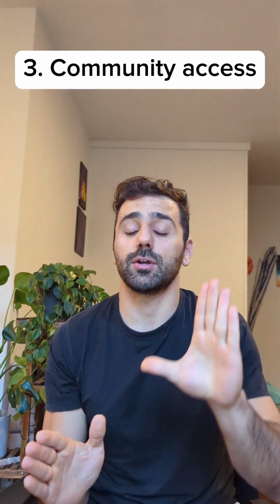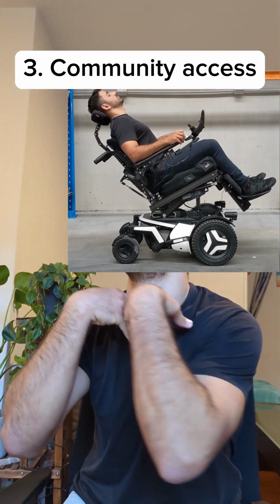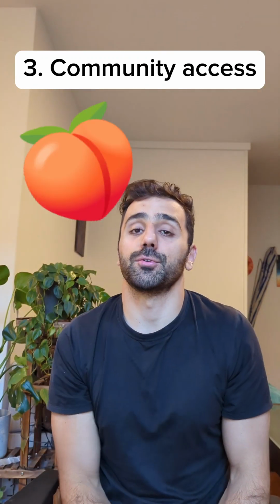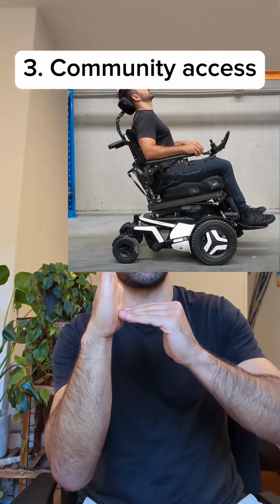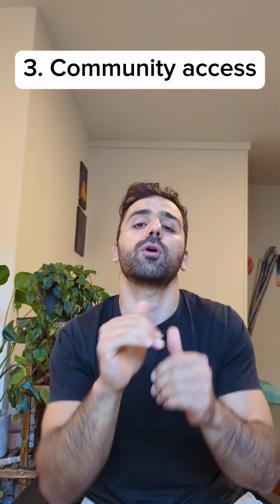Woo! Gravity! Number 3 is community access. Now, tilt obviously helps us when we go downhill because we can tilt backwards so we don't feel like we're going to fall forward out of the chair. But it can also help us when we're going uphill because when we tilt, our feet come higher and we're less likely to have our feet scrape all over the gutters.